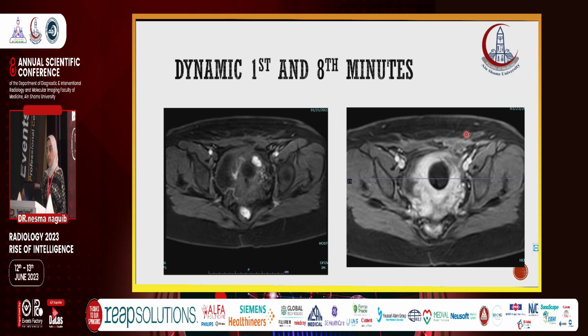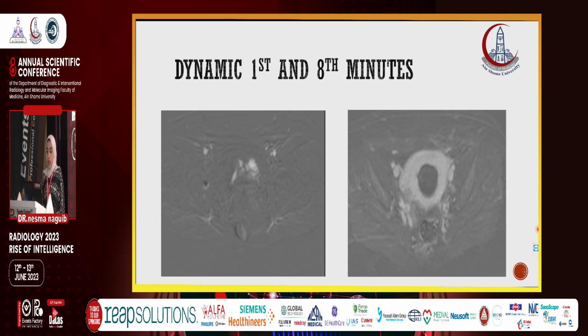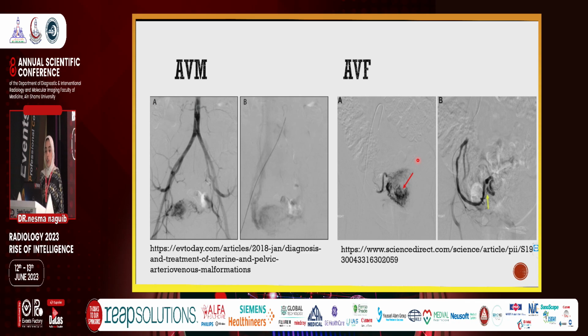So we can see we have a post-traumatic arteriovenous lesion. This is a subtraction image. We can see the same arterial enhancement early, first, second, and late washout. So we are suspecting an arteriovenous lesion, which is either an arteriovenous fistula or an arteriovenous malformation.